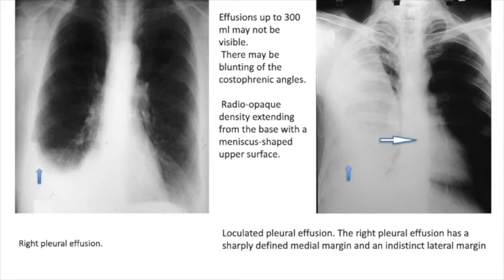Remember, in total atelectasis it is the opposite. It's very important to be very clear, because that is the difference between atelectasis and a massive pleural effusion, and you're going to be dealing with these diseases almost every day.